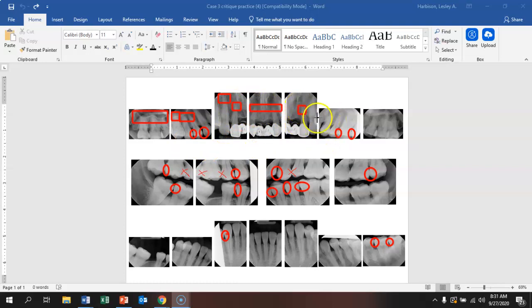This one, I'm having a hard time, but I think, unless that goes off the image, I was assuming the apice ended here, but I see something like that. I'm just going to pretend that I can see the canine and that it's there, but I have a feeling it's going off the page. These here, they would just barely squeak by. This is almost not really 2 millimeters above this one.